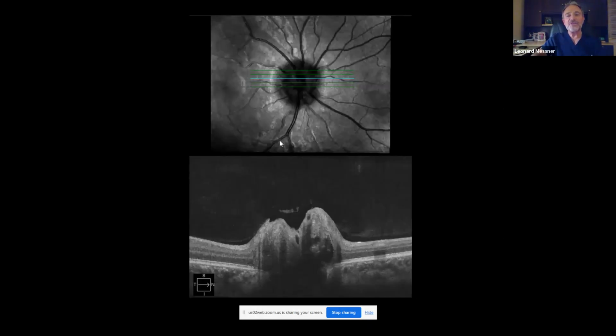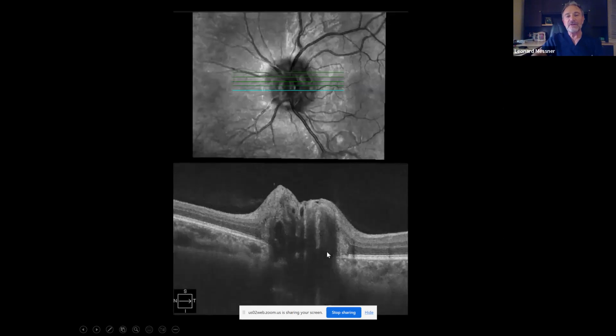And this is exactly what you can see here in the right eye, this aggregate of drusen along the nasal aspect of the nerve. Here in the left eye, similar optic disc drusen, particularly within the nasal aspect of the optic nerve. The disc is elevated, the cup is pretty much absent, and the RPE-Bruch's complex is going down. It's deviating posteriorly.